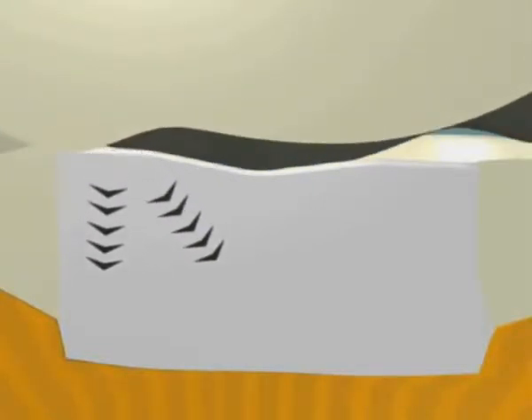Glass ionomer cements provide exceptional stability of the adhesive interface over time. Many external factors will challenge the integrity of bonded surfaces. For example, pulpal fluid, transmitted occlusal stresses, and thermal expansion-contraction stresses. Potentially most challenging to the integrity of a bonded interface is pulpal fluid.